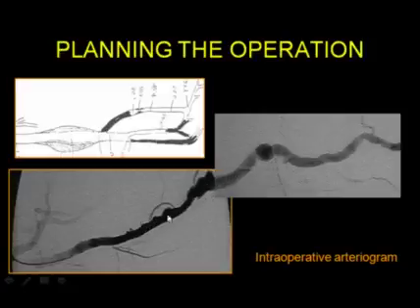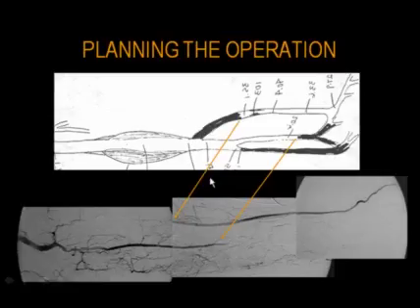Of course, you only see the lumen here in this patient with a lot of clot within the popliteal artery aneurysm. Distally, we can see that there is a patent anterior tibial artery, which correlates very nicely with the duplex scan. It's occluded at its origin. The peroneal artery is not visualized, it's occluded, and the posterior tibial artery is not seen.